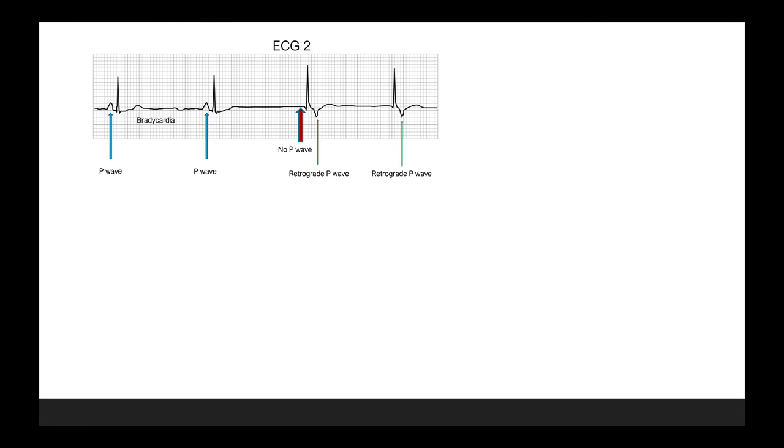So what we notice is that in the first, there is definite significant bradycardia after the first complex. Probably what has happened is this sinus bradycardia has become so severe that the AV junction had to step in as a secondary pacemaker. So after the first 2 complexes, because of prolonged bradycardia, the AV junction steps in as pacemaker, and it sends impulses backwards into the atria, which causes the retrograde P waves in complexes 3 and 4.